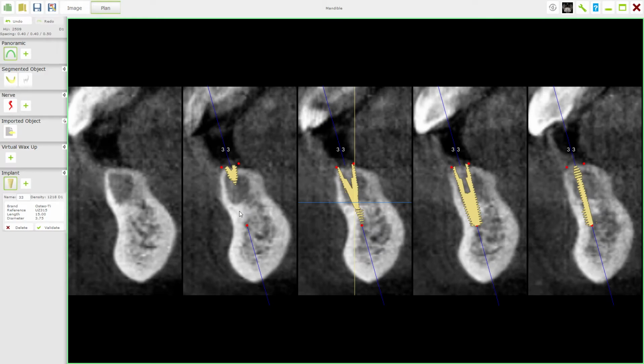Now, when we come to actually place the implant, this is very useful information, because you now know what to expect with the bone. You're going to find it's very dense to drill through at D1, so you're going to need a little bit of pressure. Then it's going to drop, and then you're going to hit this D1 bone, which means you have to put more pressure on it. So you might be wondering what's happening. I'm using my drill. Oh, it's dropped. Oh, have I perforated? Have I come out somewhere? Am I in the nerve? These are all the sorts of things that will be going through your head whilst you're doing this. But now with this, you know what to expect with the drilling.